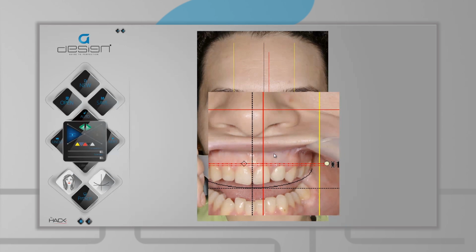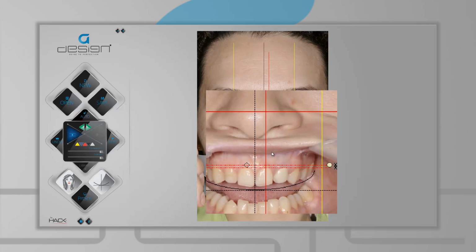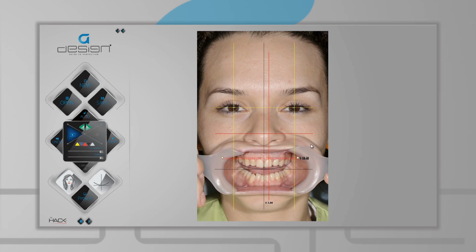After setting the two dotted red lines, the continuous red line is placed above them so that the values are the lowest. The ratio of the distance between the dotted red lines and the continuous red line is as small as possible. If the vertical axis does not cross the midline papilla, or if a different position is desired, this can be transferred to the model by the vertical guiding line, which will be set according to a nearby reference point, the lip frenulum, the mesial edge of a tooth, etc.